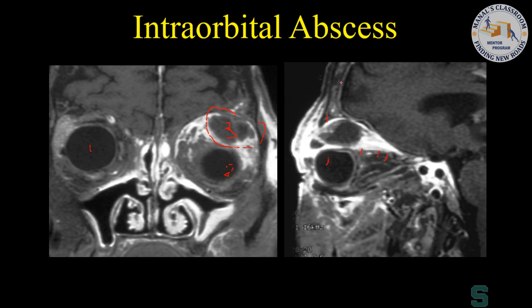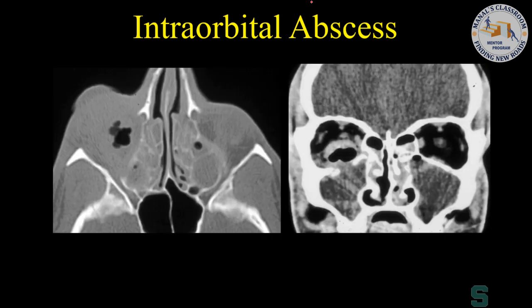And if you look closely intracranially, what else are you seeing here? This is what here? Enhancement. This is all meningitis. So the patient not only has an intraorbital abscess, but they have a meningitis.